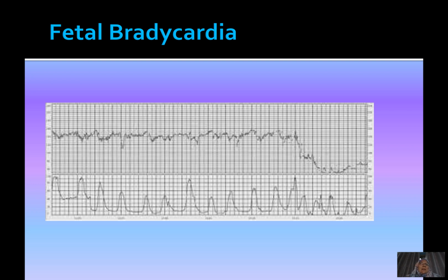The CTG, the baseline rate, is normal. I cannot see the actual number, but it is a normal baseline rate initially with normal variability. You see occasional slight drop in the heart rate, but quick recoveries.